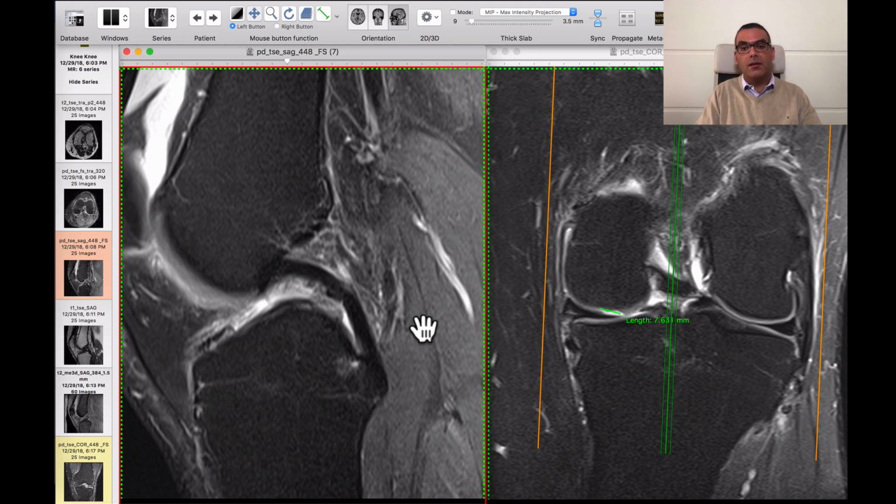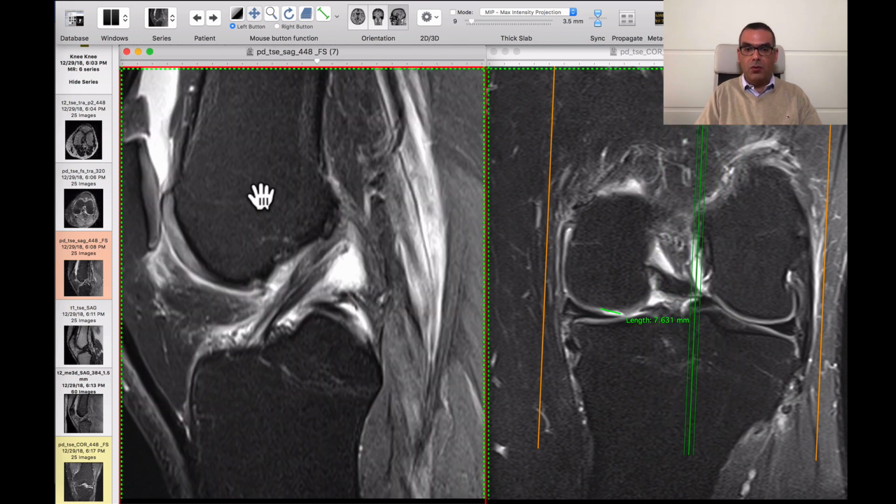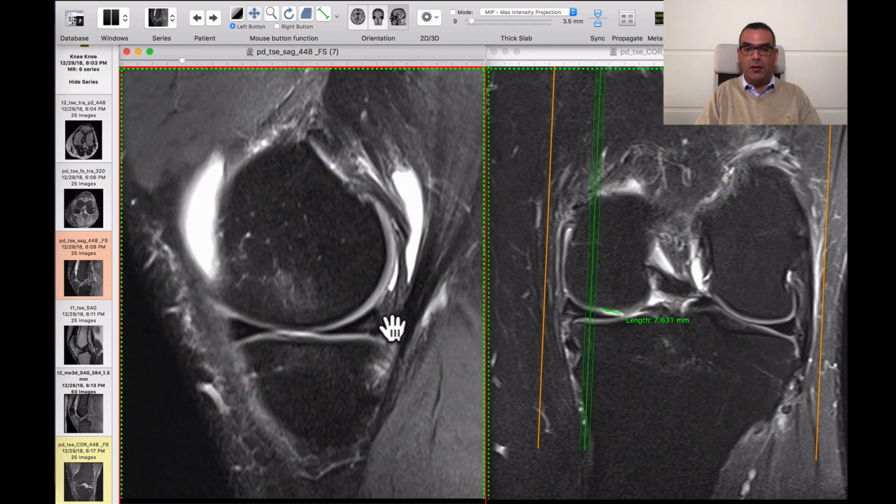In other cases, wide ulcers, they may go to mosaicoplasty, they may go to chondrocyte transplantation or allografting, whatever the technique available for the orthopedists. But you have to give them the information they want, because the decision relies on what we tell them in the report.